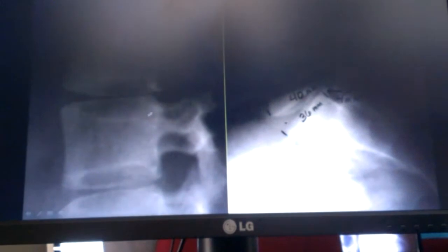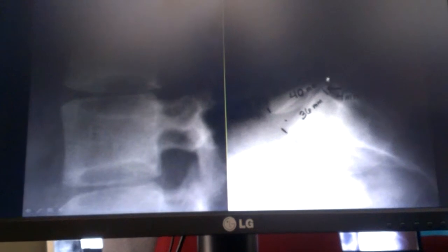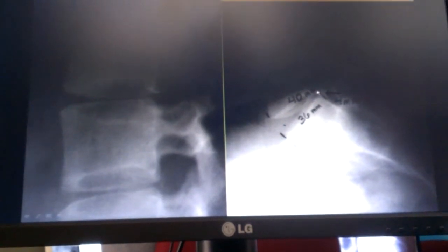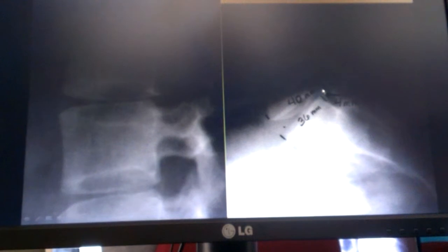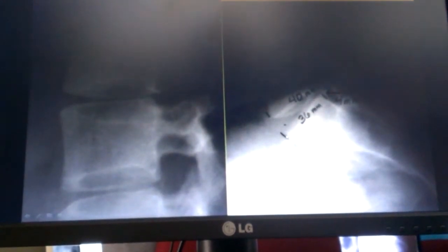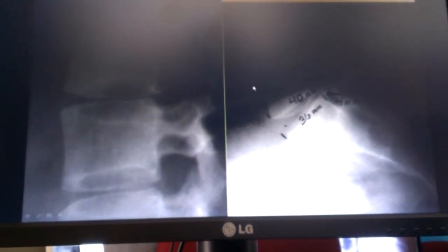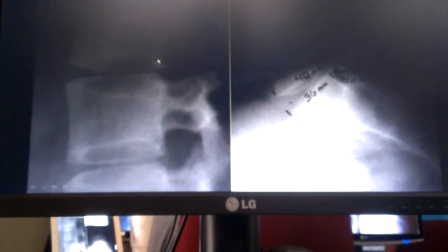Okay, so rotation and lateral flexion, we've talked about that before. The fact that you can see the undersides and top sides of vertebral bodies tells us that that's what's going on. Here, rotation will give you a pseudo-retrolisthesis appearance if you're picking up the wrong cortical margin, all right? It's also true that we know that the inferior end plate of L5, for example, needs to measure the same as the sacrum, just like all these other end plates have to measure the same. Otherwise, you've got pseudo-retro. But we can tell if there's rotation here. Here's one cortical margin on one side, one on the other. Not a lot of rotation here.